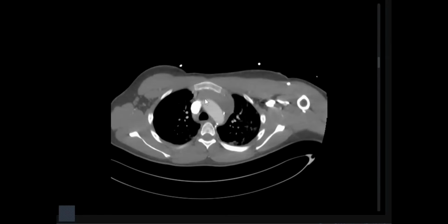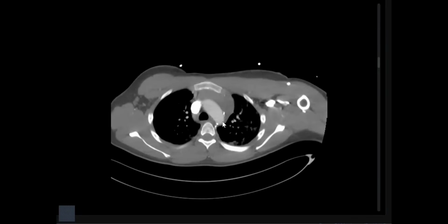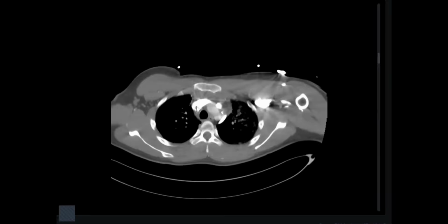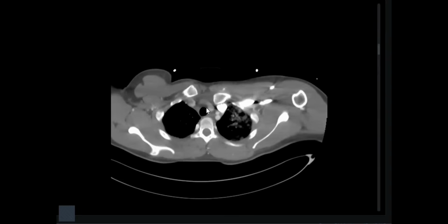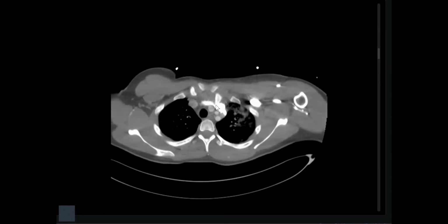What are the major sources of this hematoma? Either arterial or venous. Very good. You said normal aortic contour and no extravasation. But what is the source? Most likely venous, if not aorta. Try to trace the veins. What is this? Superior vena cava. What is this? Left brachiocephalic. Why is the left brachiocephalic narrowed here?